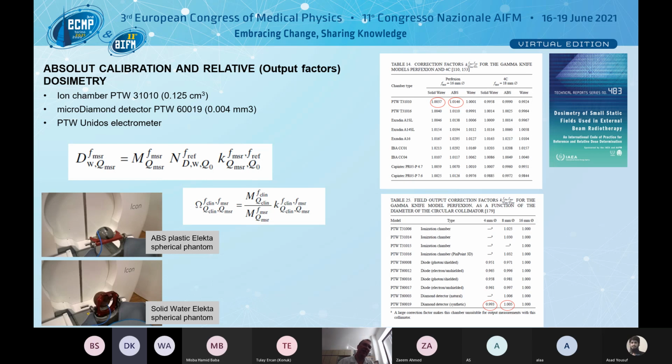Similarly, here we have a cylinder, and if you insert your chamber, it should sit nicely in the center where all beams are focused. Right now you don't need a special machine shop and to try to explain what you want.